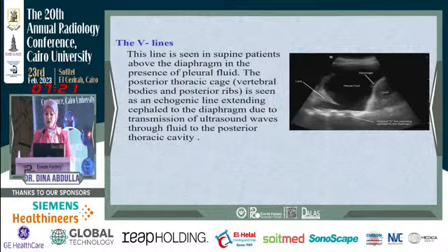A male, 41 years old, had a blunt trauma to the chest two days ago, presented with severe left-sided chest pain. Here we can see that there are multi-level rib fractures on the left side. There is left-sided hemopneumothorax. And of course, there are subpleural contusions, subpleural consolidation areas with partial lung collapse, and there is surgical emphysema at the left side of the chest wall. In image C, we can see that there is disruption of the pleural line.